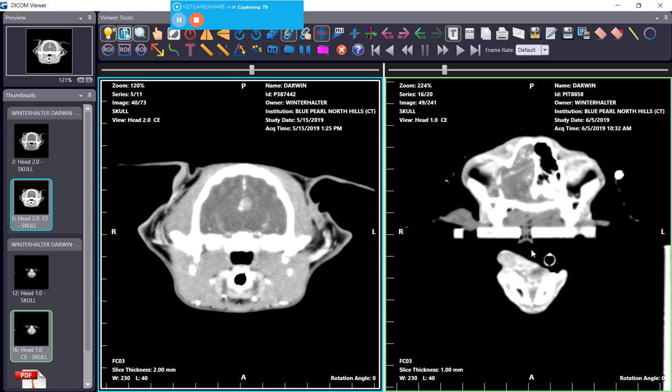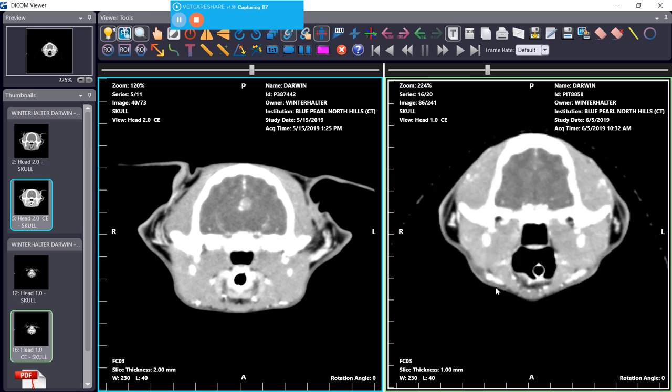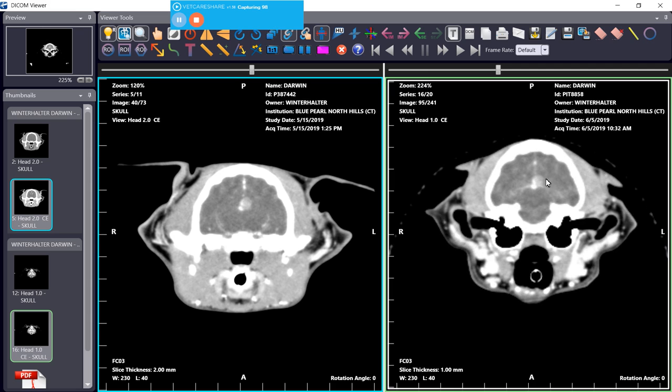It may look a little different because these slice thicknesses are 2 millimeter on the left, and we do them for radiation planning. We tend to do 1 millimeter. So every time I move the little contrast, I'm moving twice as many slices. But just to get in the general area, this is that on the right-hand side on June 5th. This is that central area, that bright area. And again, very much unchanged, just a little ball sitting right there, and it measures the same as what it did last time.